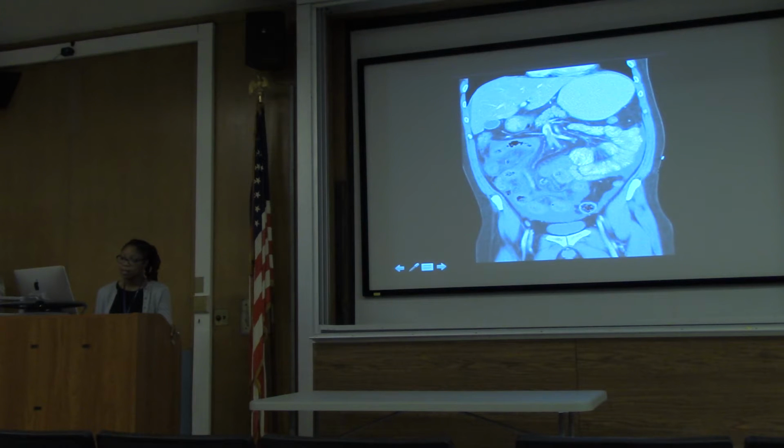Ischemic colitis, because we can see thickened small bowel loops with enhancement of the mucosa. There is a lot of fluid around it. There's interloop fluid, and what is suggested in mesenteric ischemia is stranding of the fat in the mesentery. There's a lot of fluid in the abdomen. So this patient has an SMA thrombus with the development of mesenteric ischemia. Okay, any questions?